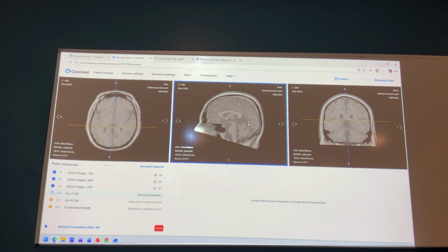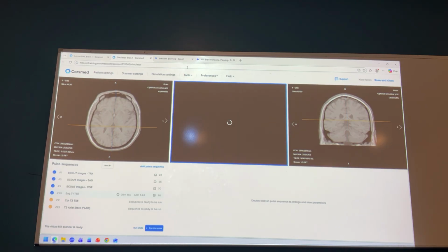You know, like on MRI Master, when it's parallel to something, the box has to be right on that, not next to it? The parallel has to be the slices. It's not the box. The FOV box is different, but yes, the slices should be parallel or perpendicular. Let's say parallel to the midline of the brain, so it has to be right on top.